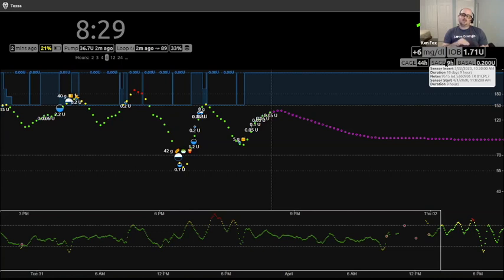But you can see when we put the sensor in originally, which is on the 22nd, which was 10 days and 9 hours ago. And for those of you keeping track, the sensor's only good for 10 days, right? And then I added notes, and I put our start code, the lot number, and the transmitter ID, because those are the things that you need to restart or you need to call Dexcom, right?